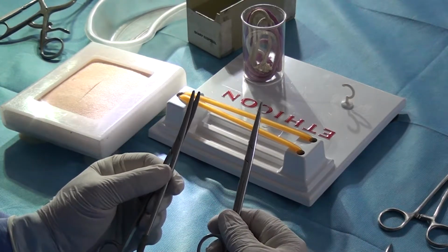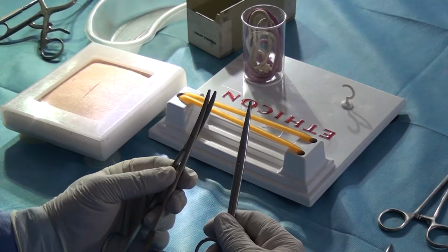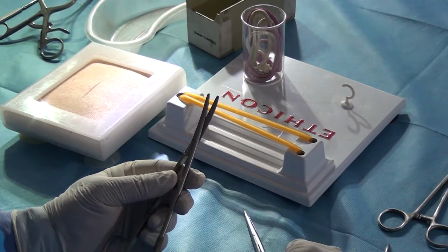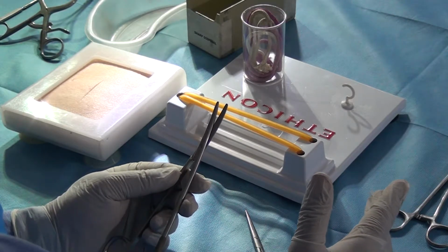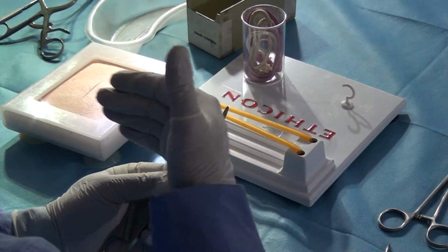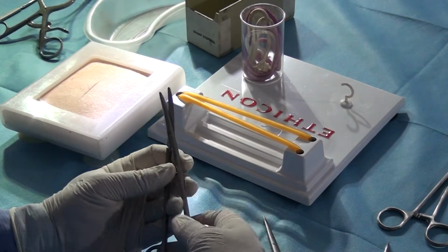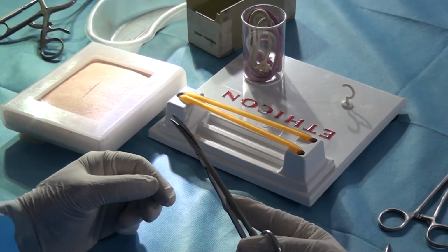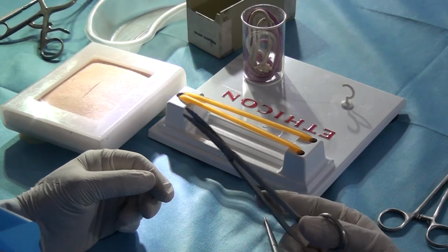Why have two types? That's the question. Especially in your final year you're asked. Look, scissors would be used mostly for cutting but also for dissection. At the same time, you want to use it in a straight line. If I use a curved scissors, it allows me a look at the tip all the time. Either the tip is up or tip is towards me.